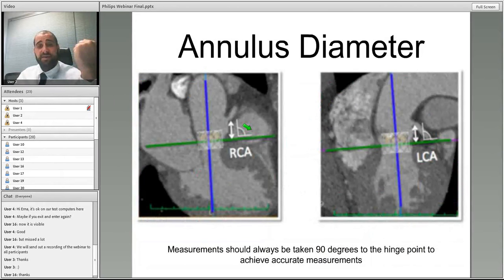And again, when we place the valve, we need to look at the distance between the left ventricular outflow tract and the right coronary artery and left coronary artery. If the distances between the left ventricular outflow tract and the coronary arteries on either side were too low, and we opened up this valve where we had the old valve being pushed aside, we're going to cause myocardial infarction and reduced blood flow or complete obstruction of blood flow to the coronary arteries.